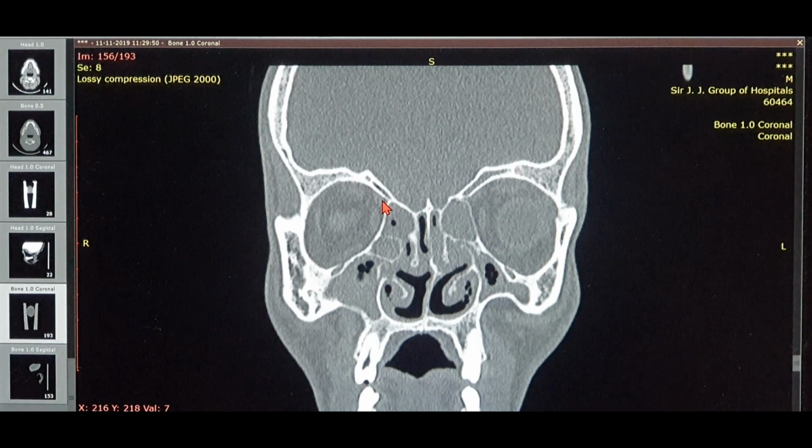Now, there's one more confusion. The examiner may also ask you, okay, now you found the anterior ethmoidal artery, now find me the posterior ethmoidal artery. Trust me, guys, the posterior ethmoidal artery is normally not visible. If you look very carefully, you can definitely see it. Now see, this skull base has a slant, right? It has an angle to the cribriform plate.